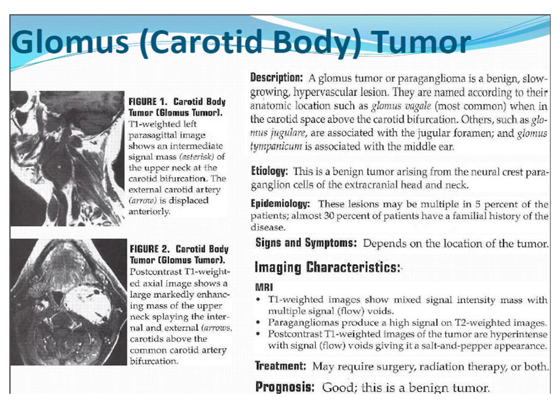This is also a benign tumor, but it usually has to be resected as well. So if you saw any tumor in that location, or basically any tumor in the neck, you would definitely want to give contrast. And one other thing on these, they may have flow voids in them that you usually see a little bit better on the T2 weighted images. It gives it a kind of salt and pepper look.